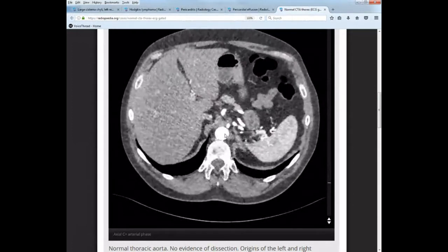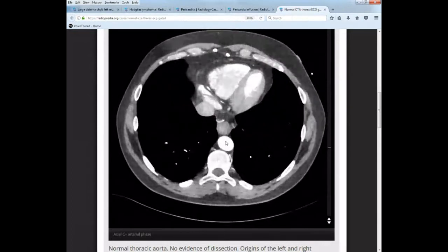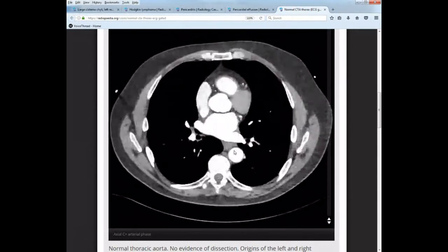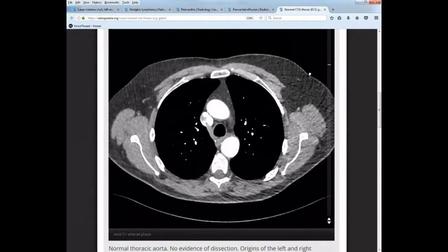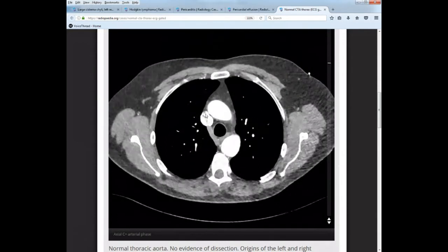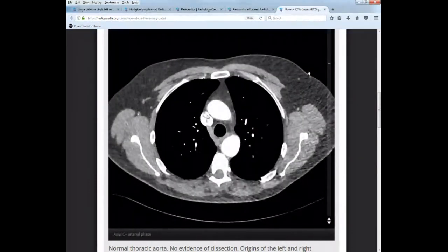Okay, remember we've talked about that. So I'm seeing arterial vessels, but I'm not seeing venous vessels yet, because it hasn't had enough time to travel through the body. So because of that, my azygos vein, which is receiving deoxygenated venous blood from the lower extremities and the lower lumbar area, is dumping blood that does not have contrast in it yet into this highly opacified superior vena cava that is directly receiving contrast from the left arm.